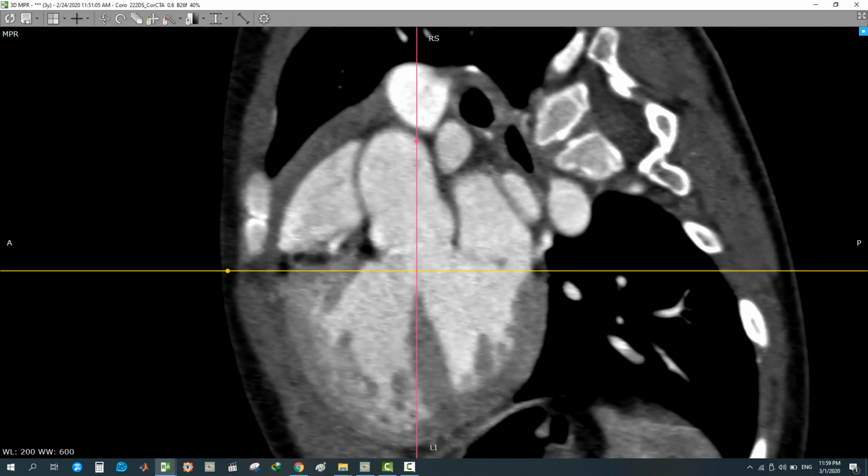This is a conoventricular VSD, 80% perimembranous and 20% outlet. Okay, you can activate this measurement like this, length from here to here. This aorta overrides both ventricles 50-50. Okay, and this VSD, conoventricular VSD, measures 14 millimeters.